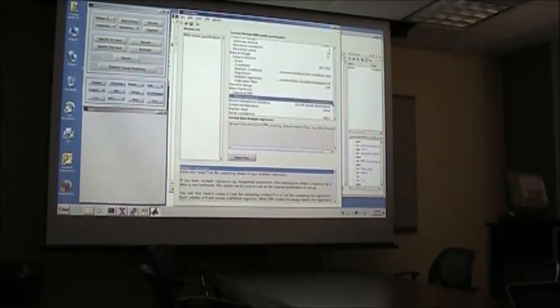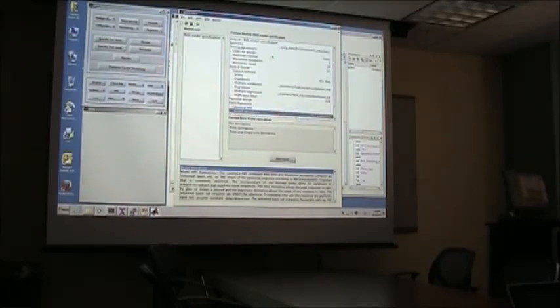In any case, this is basically all the information you need to set up this first level model. You have your scans. You need to select the directory. You have this file that contains all the information on the conditions. SPM uses a specific format in there, so if you want to know how to set it up, the SPM website has some information, and the manual also has some information on this. And you enter some regressors, some things you want to correct for. In this case, the movement parameters.